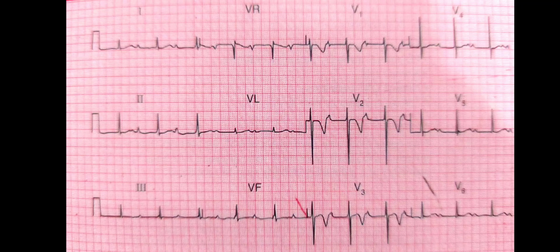Then you cannot actually generate those real signals in your mind that will help you in real life to get the proper diagnosis. So whenever I upload an ECG, as I have told you, we will be practicing random ECGs. Just pause the video once and try to comment on that ECG yourself, and then proceed for the findings.